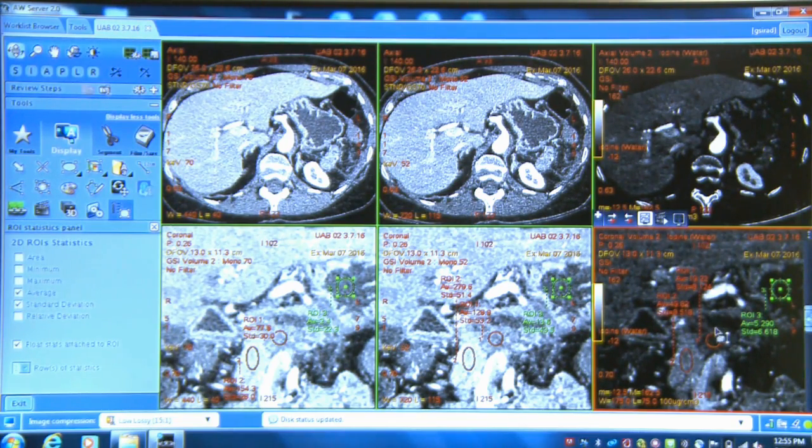However, on the iodine images, these are not Hounsfield units. These are in terms of milligrams per cc of the material being studied. So here you can see the actual unit is times 100 micrograms. So if we have a value of 5.29, this is a value of 0.53 milligrams per cc iodine. And you can use that quantitatively, and some folks have done that looking at actually response to therapy.